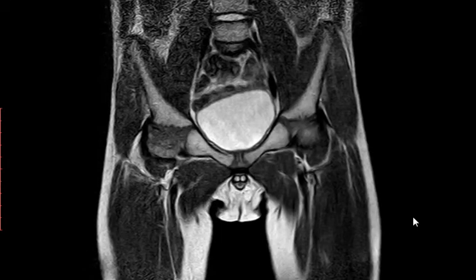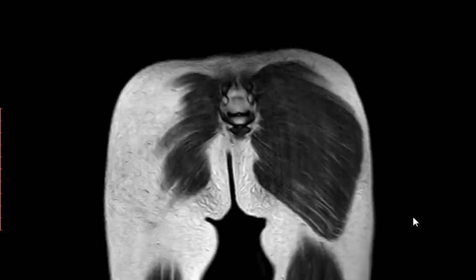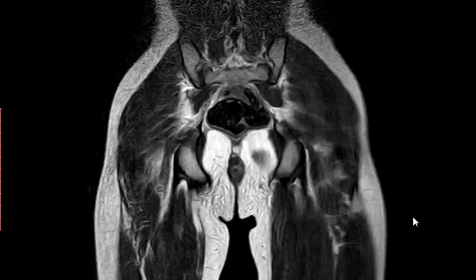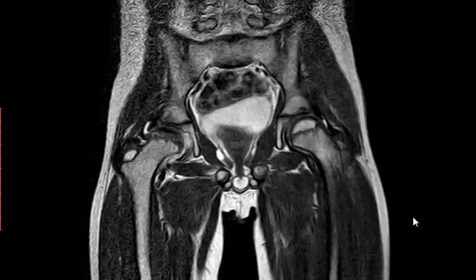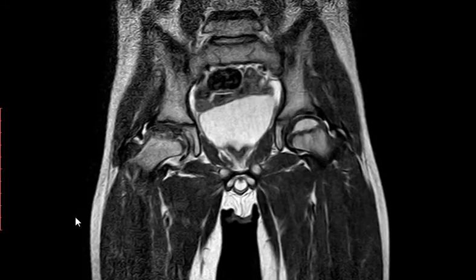It was a bilateral hip MRI. And what do you think is going on here? It's a relatively straightforward case. First of all, this is an MRI of the hip joint of a female child. Coronal, axial, sagittal. This is coronal. T1, T2, T1 Fatsat, T2 Fatsat. Contrast, or not contrast?